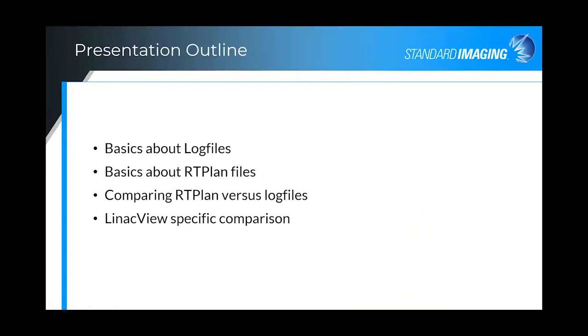During my presentation, I will begin with the basics of log files for those not so familiar, then move into the basics of RTPlan files, so that consideration and comparison at a very high level can be reviewed between the RTPlan file and the log files. There are lots of details involved, and so we will only touch on things at a very high level. Finally, I will finish up with some specific comparison mechanisms available within LinacView.